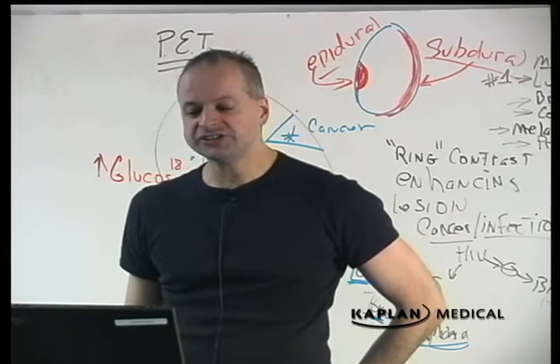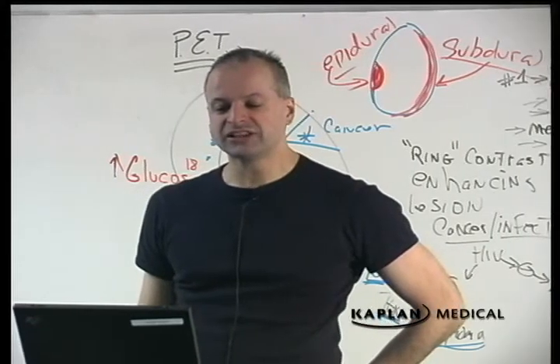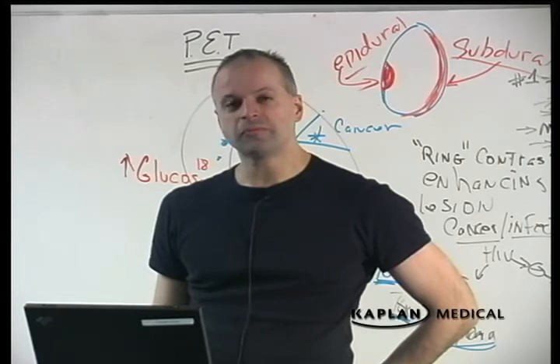This is a head. Yes, it's a head. Well, why am I showing you skull x-rays? What is the utility of the skull x-rays? The utility of the skull x-rays is that the person gets multiple punched out lesions.